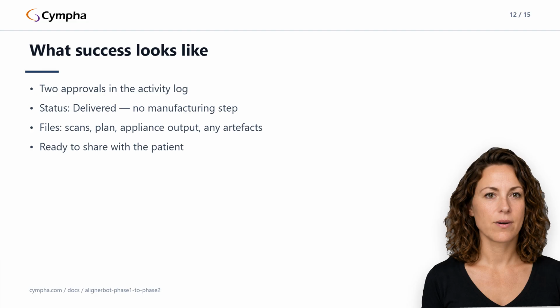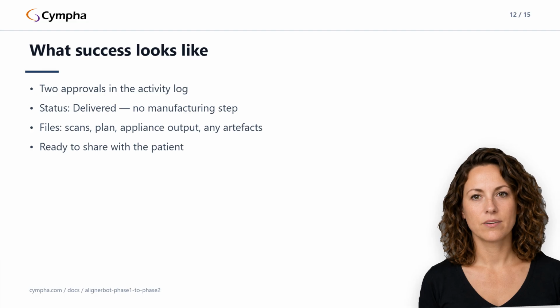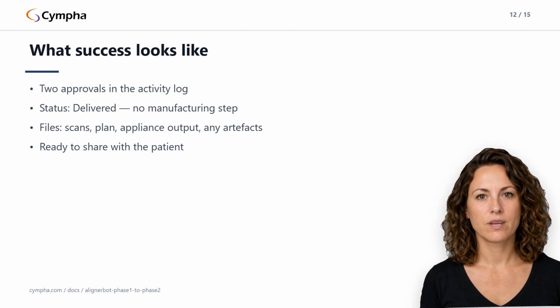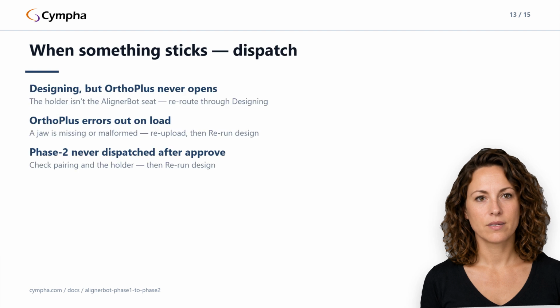So the clinician did their part and the agent didn't pick the case up. Start by checking that the agent on the operator's workstation is still paired. If it is paired and still nothing dispatches, then the case may have moved off the AlignerBot user. Go to the case page, check who currently holds it, get it back to the right holder, and then use Rerun Design. And the second group, which is about the revision loop.